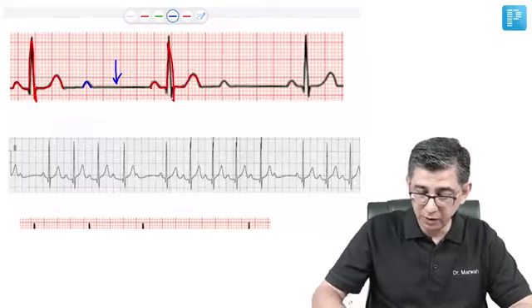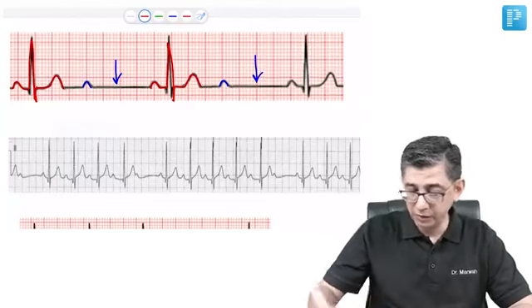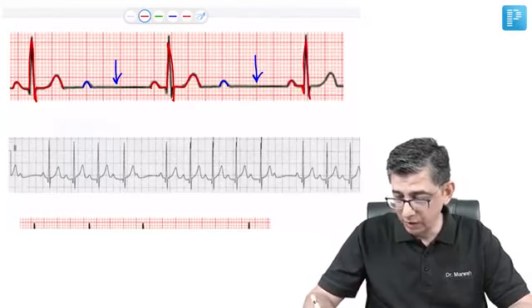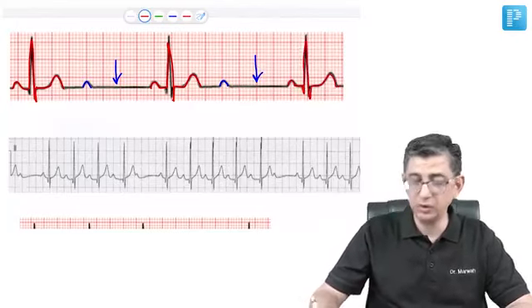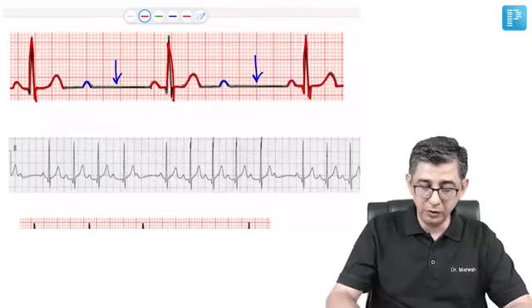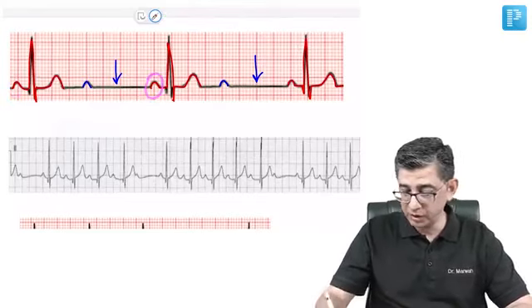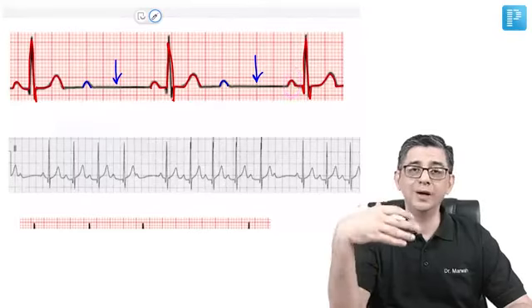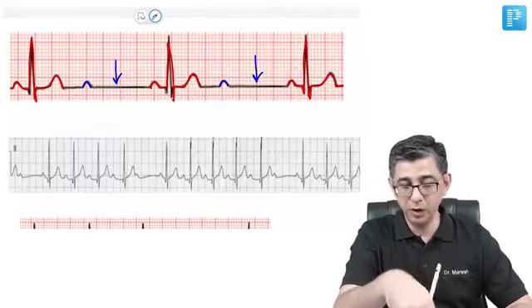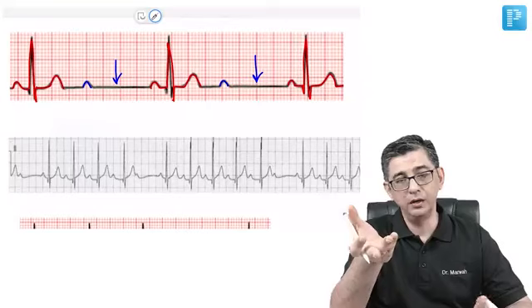And then the same thing happened once again. P wave came up, there was a drop beat. Let me finish the tracing once again. This is P, this is Q, then R, and then S. So we are once again having a normal sinus rhythm. The highlight of this particular ECG is, for every one, listen to the words carefully, for every one conducted P wave, where I'm putting the markings at the moment, the one in red, I'm going to call them conducted P waves, there is one P wave which is not conducted downwards because no QRS complex actually occurred.